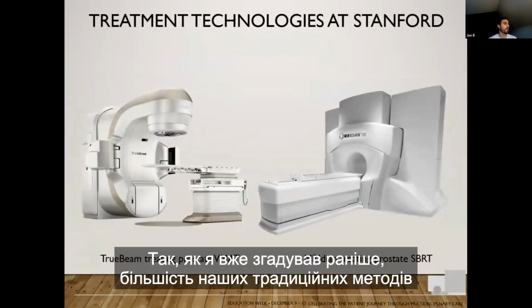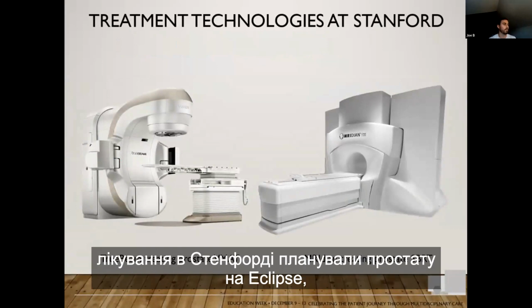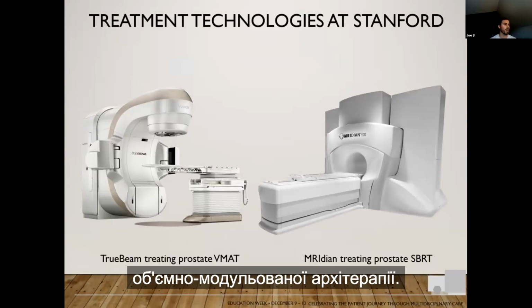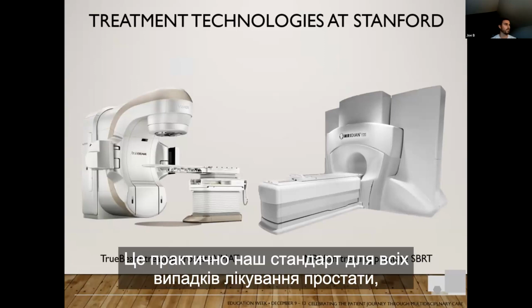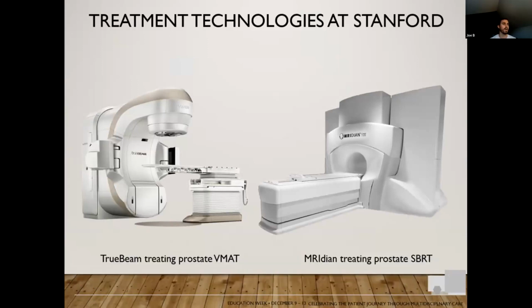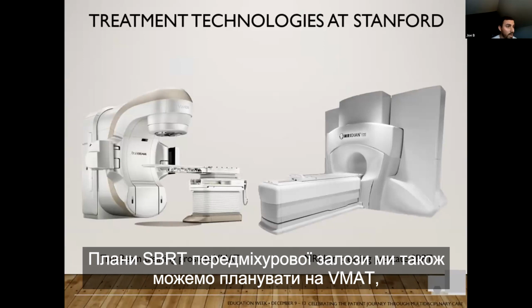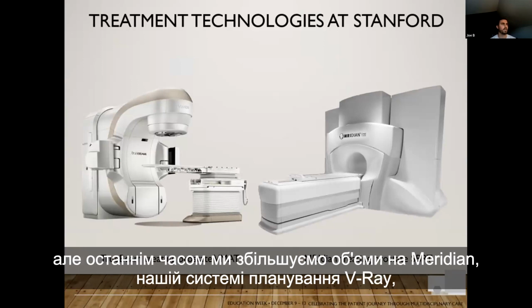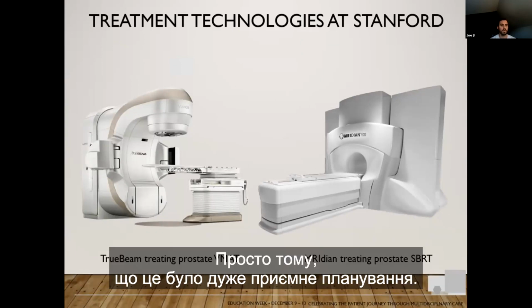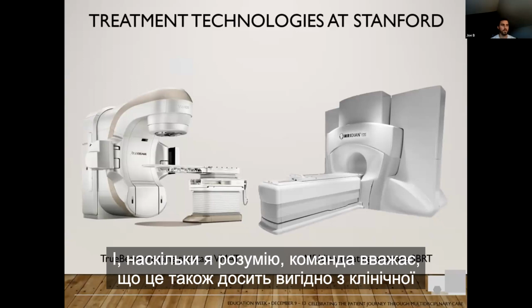Yeah, so like I mentioned before, most of our conventional treatments at Stanford, we're planning prostate on Eclipse, and we're treating using the TrueBeam linear accelerators, using volumetric modulated arc therapy. That's pretty much our standard for all of our prostate and lymph node, prostate bed and lymph node cases. And then for the prostate SBRT plans, we can also plan them on the VMAT, but we've been recently ticking up the volume on the Meridian, which is our ViewRay planning system. So I will give you guys a little bit of insight into that, just because it's been really nice planning on there, and my understanding from the team is that it's pretty advantageous clinically as well.